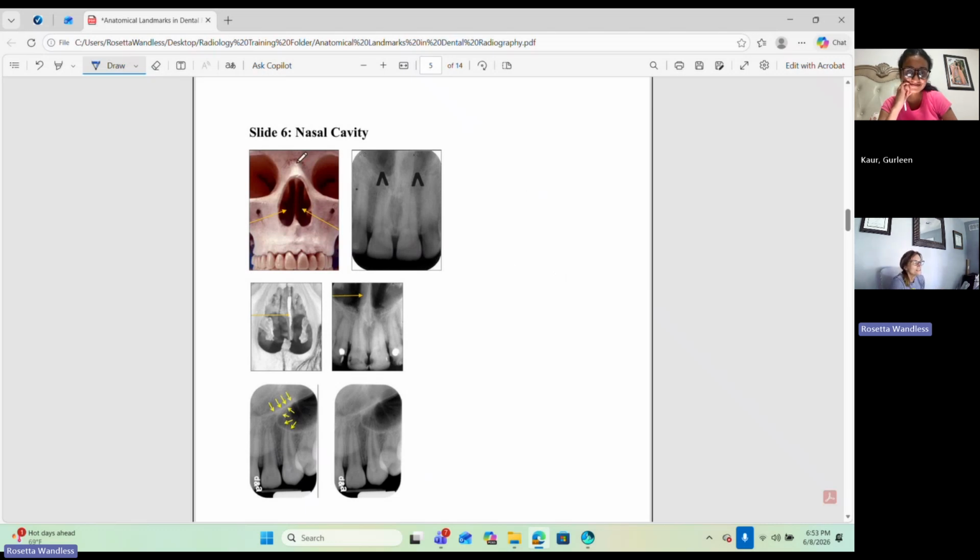Here, this is just showing the skull. We know this is a septum. It's the division of it. So here we're going to see that septum, and we see the nasal cavity on both sides. Makes sense, right? It's the air, the sinus, the nasal cavity.